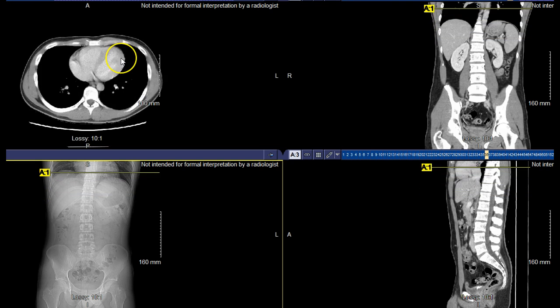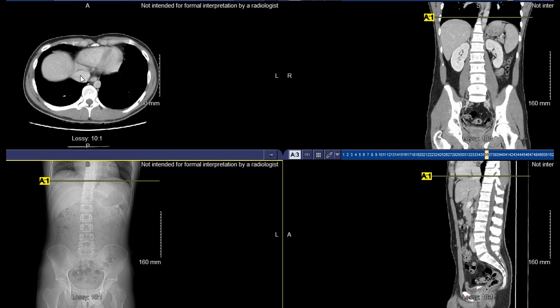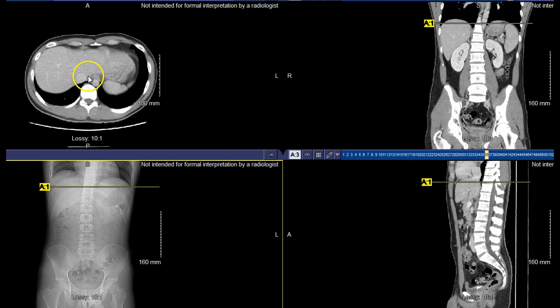So I'll go from the superior aspect down through the inferior aspect, touching on some specific structures as we channel through. As we continue to go down and get closer to the region of the diaphragm, I want you to note initially this structure here. What we were seeing here is the region of the IVC. So the IVC is the first thing that I'm really going to follow. That way you can get that frame of reference, see exactly where it's at, the inferior vena cava. And you can see it right there.